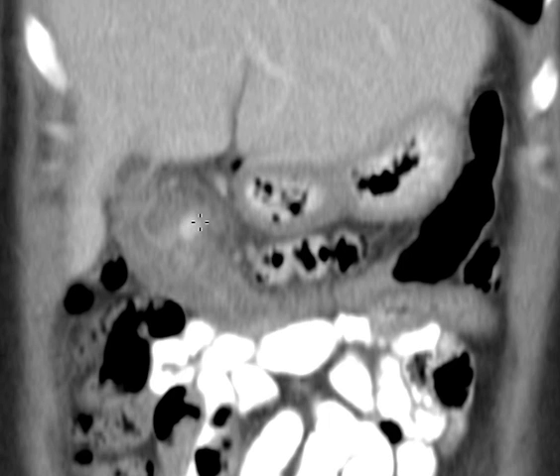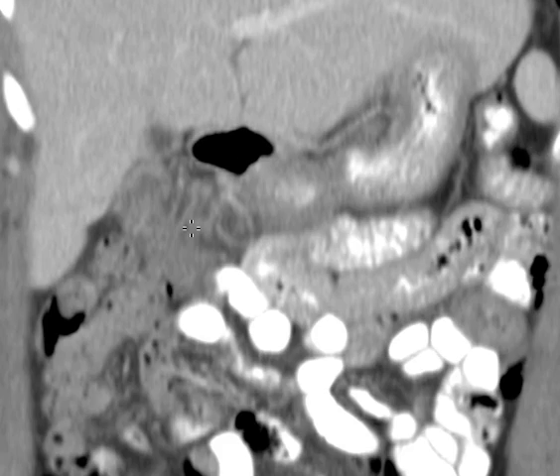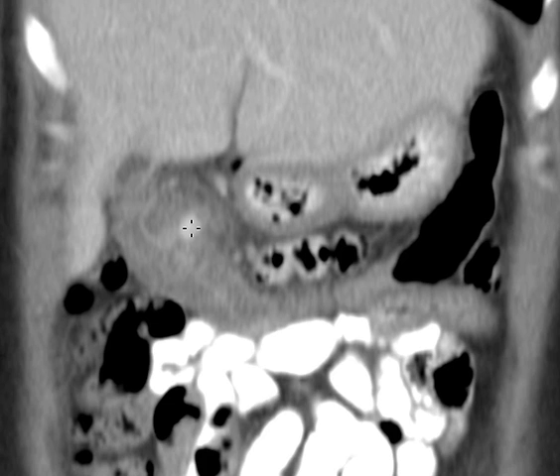This, by the way, is, as is often the case with this disease, usually quite centrally positioned relative to the abnormality. So it has probably 4 centimeters this way and 4 centimeters that way or so. So, what would you think? It's kind of peripherally located, so you have a collection of oral contrast that probably extends maybe farther than the margin of the colon right here.